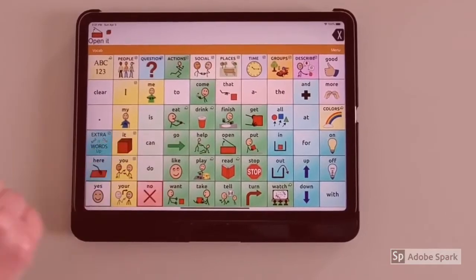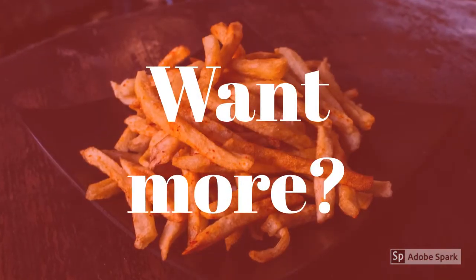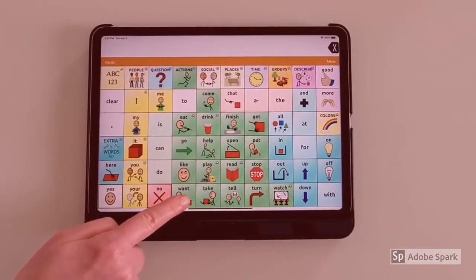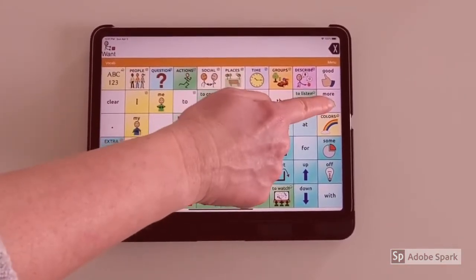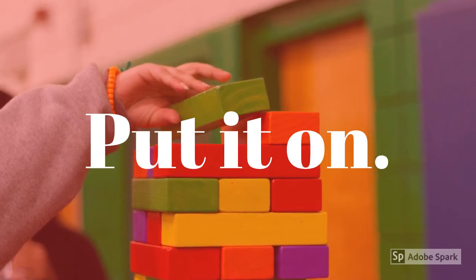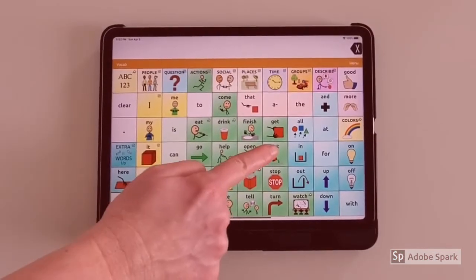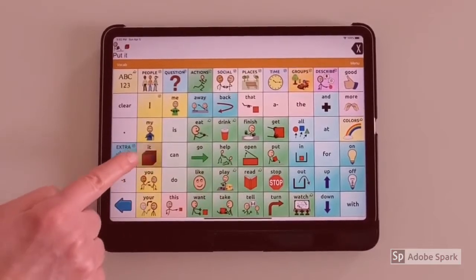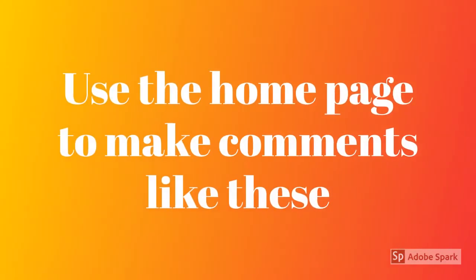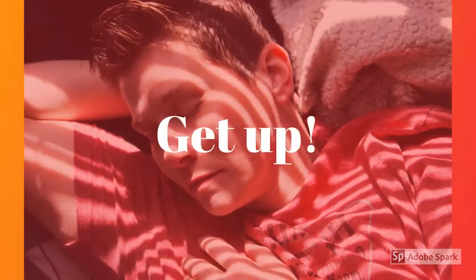Open it. Want more. Put it on. You will want to use the communication device throughout the day. Use the home page for Wordpower 60 Basic to make messages like these.